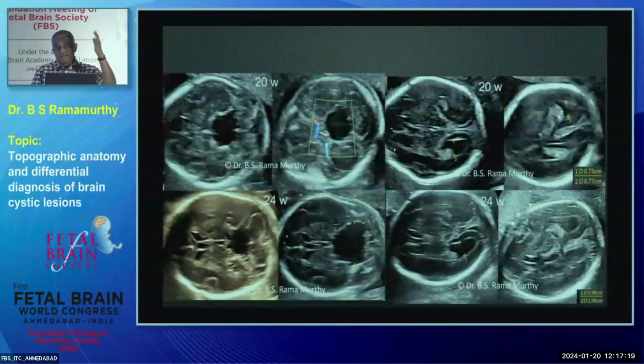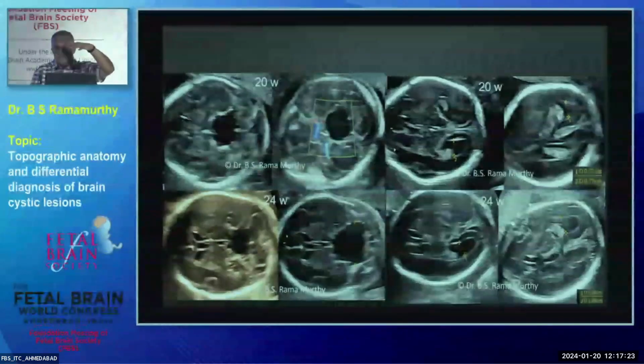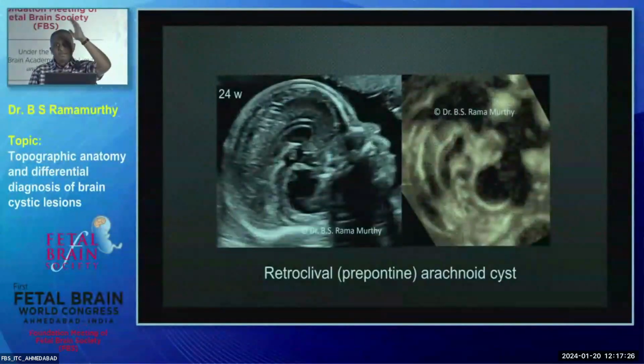Fourth ventricle, third ventricle, supra or infratentorial? Infra, supra, quickly. Yes, that's exactly right. You need the sagittal, and in the sagittal, the secret tumbles out so easily. You find the entire brain stem, which is arching over the cyst. The cyst is anterior to the brain stem, and the cyst is out over here, just sitting on the clivus.